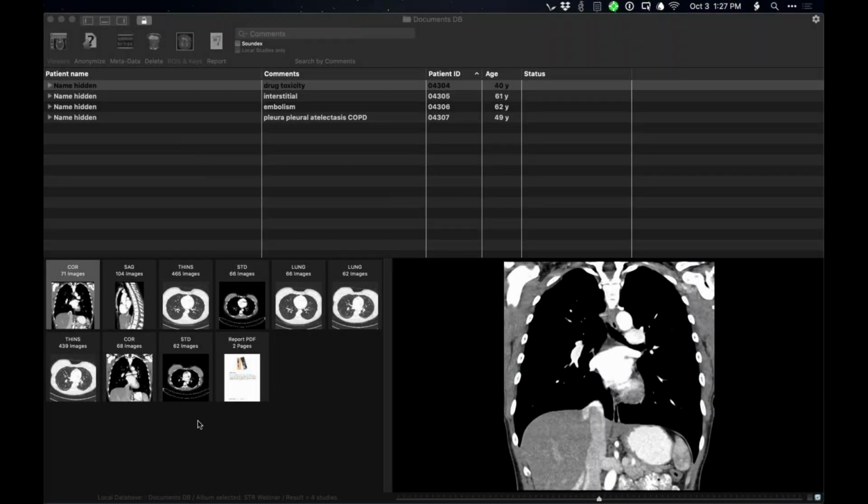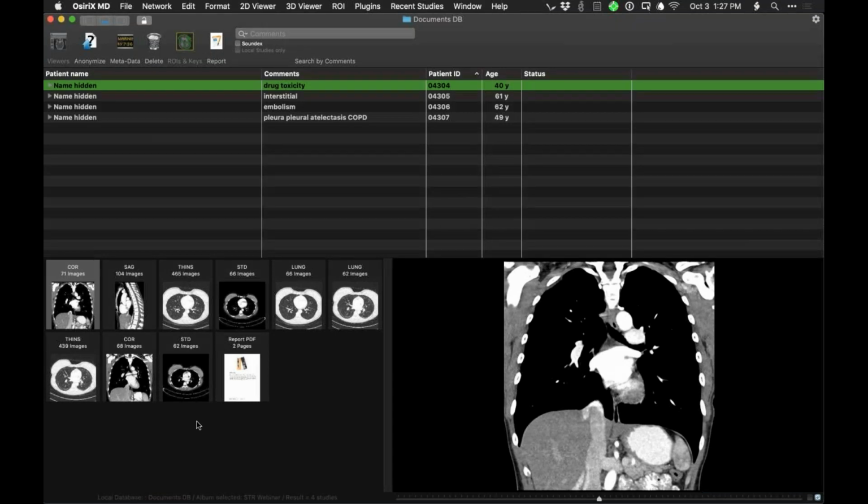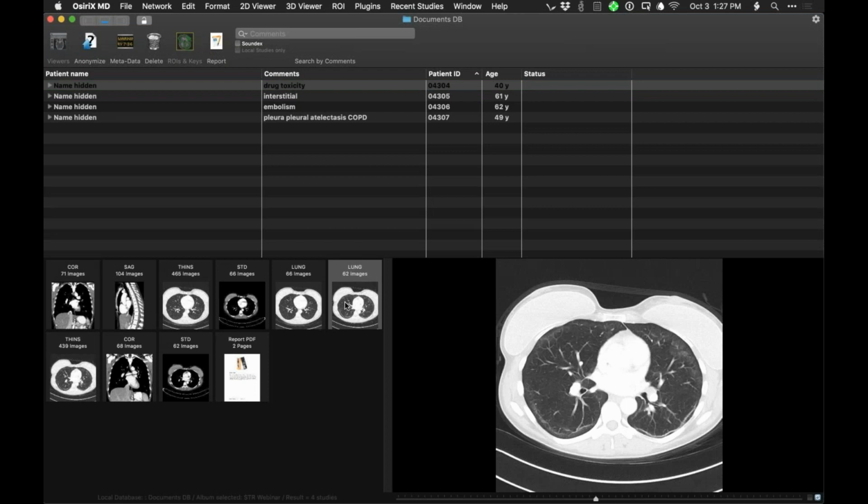Okay, I will show you this one. And before I show you the images, I'll give you the context. So this is a patient with a history of melanoma and treated melanoma. And in this context, she had her usual surveillance imaging schedule, that is a chest CT and an abdominal CT, when they come back to the clinic. And she's 40 years of age.